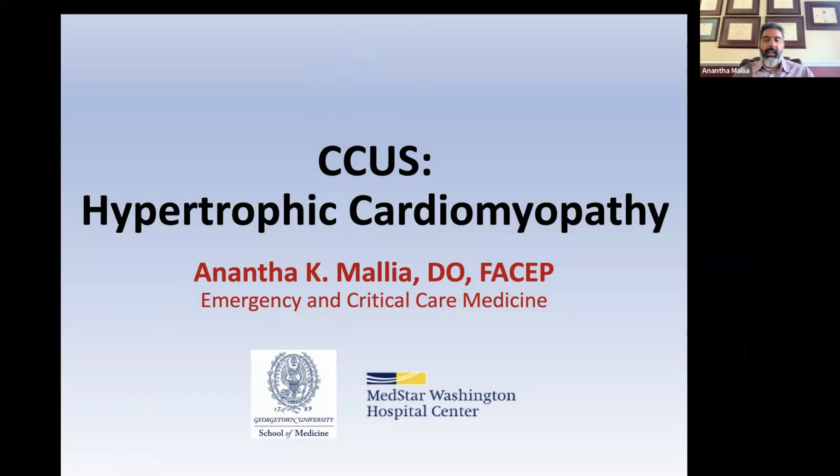Hello again. We're going to now talk about the echocardiographic identification and characterization of another specific clinical disease state. This time we're going to be talking about hypertrophic cardiomyopathy. Just like with the other disease-specific didactics, the identification and diagnosis of HCM, again, doesn't strictly fall within the purview of the intensivist.